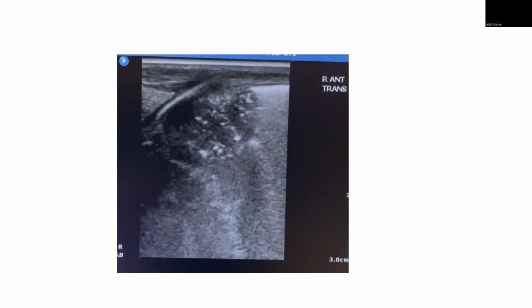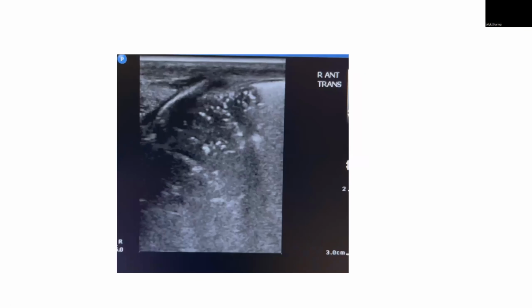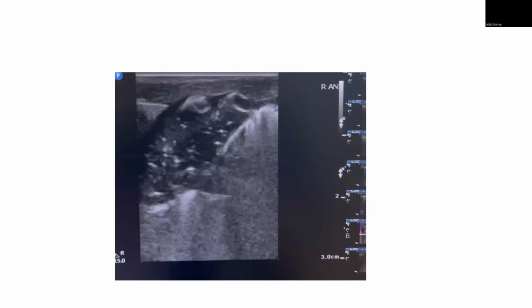When you go back to the previous image, it's a beautiful image. I'd just say that there are some areas over here where the pleural line is not established. And as I've described, often you have a combination of consolidation with atelectasis. The only reason I raise that is it's very well demarcated.